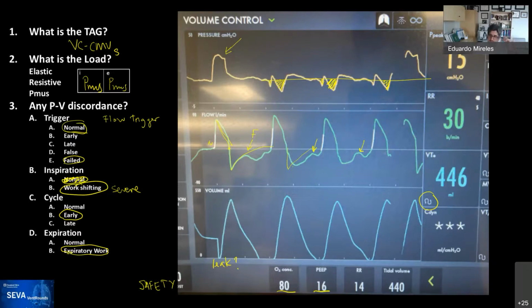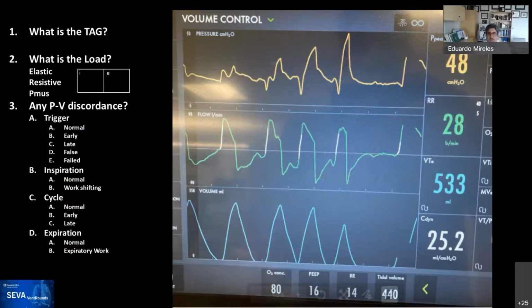Nice responses, team. Okay. It's 2:44. We have one last one, and actually it's the same patient, but I was walking away, and then he did this, and I came back and I took a picture. Anybody wants to read it? You already know what the tag is because our friend Ahmed read it. I'm wondering if anybody wants to read this one.